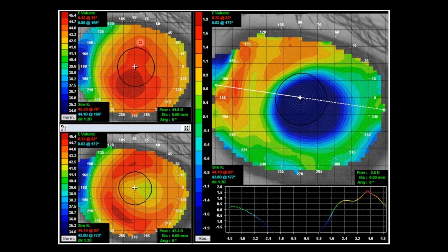But if nothing we try actually centers this treatment and the patient has good visual acuity, then there may be no reason to alter. So have a look at the baseline topography before you make any modifications. It may tell you whether a change is likely to make any difference to the fit at all, or whether you would be fighting nature to improve upon the outcome that you already have.